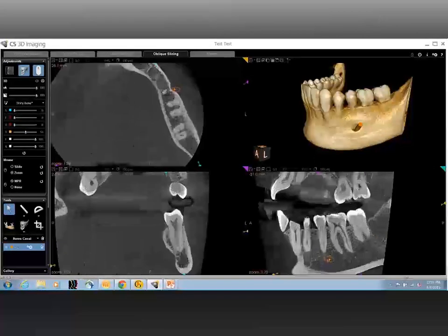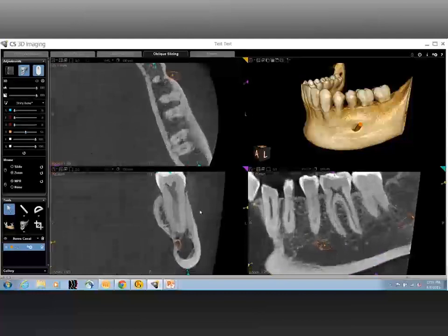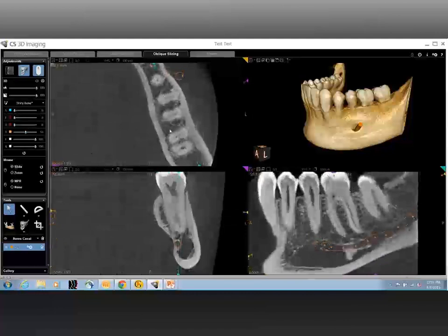So the canals themselves have to be evaluated, right from the pulpal horns to the apex, to the opening of the apex. You can clearly see that it has good value in adding the third dimension to visualizing the canals. You can also visualize it if you look at axial structures where you see the pulpal horn. If there are any missing canals, you can identify calcified canals or even calcifications within the canal, certain isolated calcifications, pulp stones, or various other things.